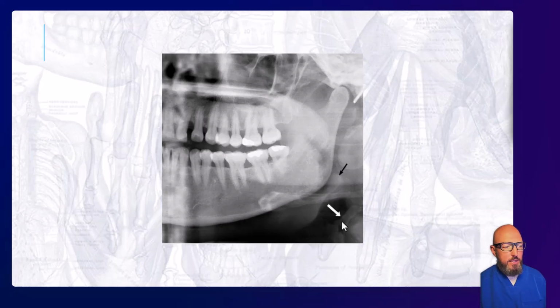Sometimes like this, you'll see calcification of the superior horn of the thyroid cartilage, because the thyroid cartilage comes right up here beneath the greater cornu of the hyoid bone. And then also you'll see calcification of a small round piece of cartilage called the triticeal cartilage. Both can calcify. Really think of any cartilage in the human body can calcify over time.